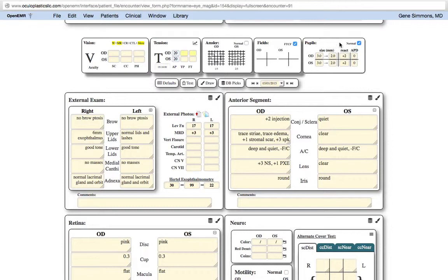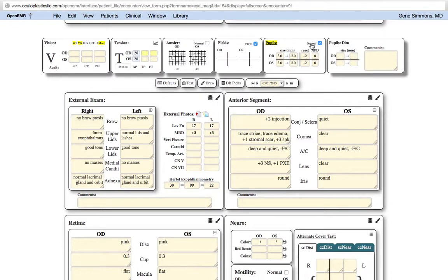The pupil exam, the pupil has the normal size and how dim does it go with light, how reactive, how quickly does it do it on a scale of 4, and is there or is there not an APD? If you need dim pupils, there is a mechanism for doing that, looking for Horner syndrome or Adie's syndrome, and this allows you to document what the pupils are in dim illumination, and any comments that you might have, such as response to dilute pilocarpine or topical cocaine.